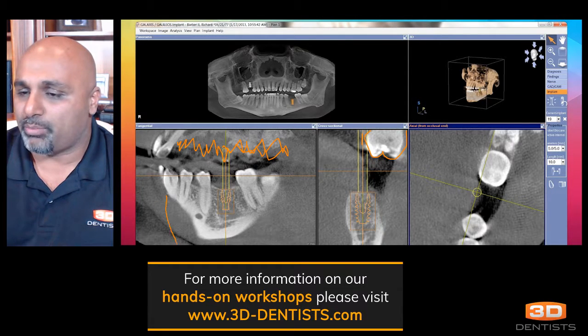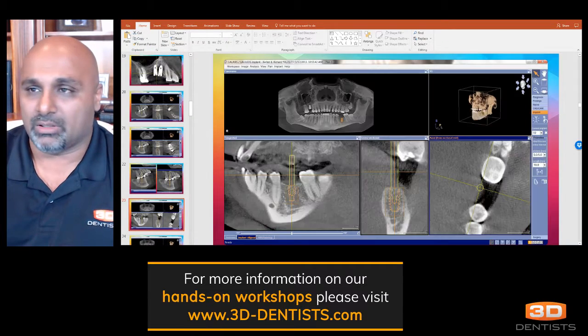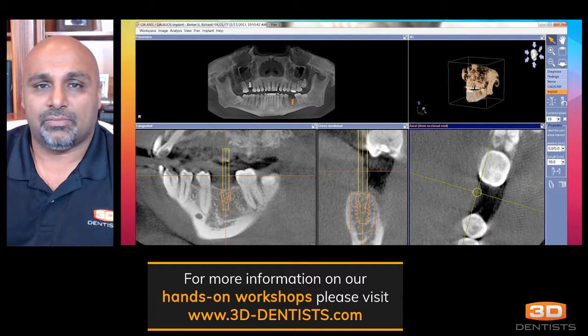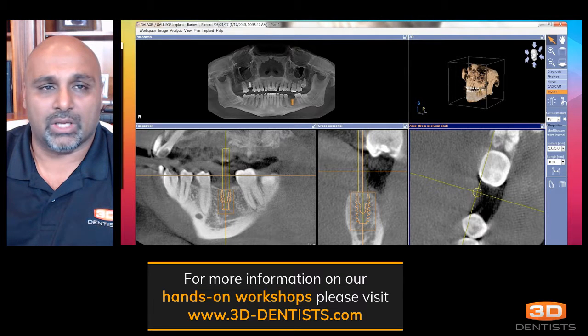Now, I do want to point out that we are working in the implant aligned view, like so. So, you know, if you're working in the panorama view, some of these principles that I'm talking about won't really apply. So I just want to keep us apprised of that. It's hard doing all of this at one time.